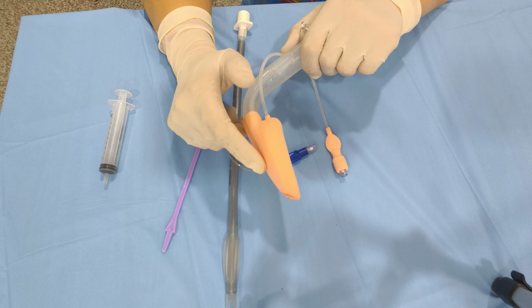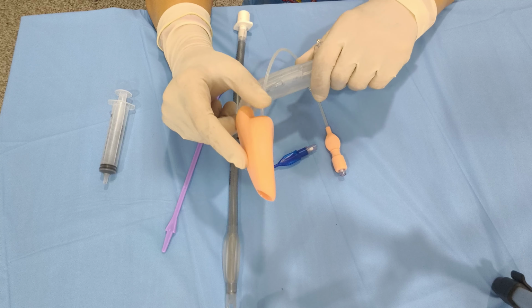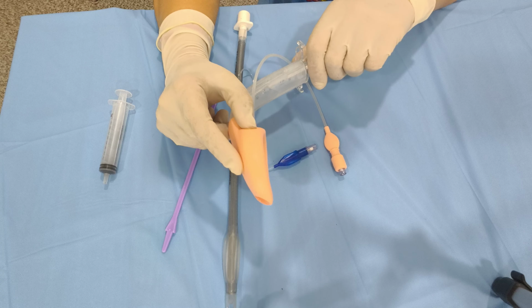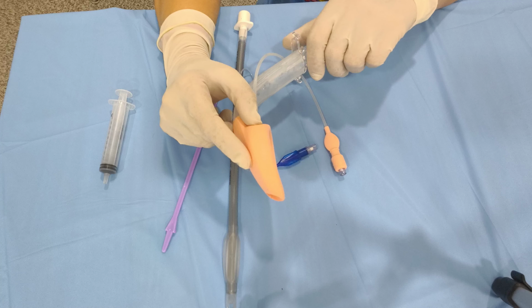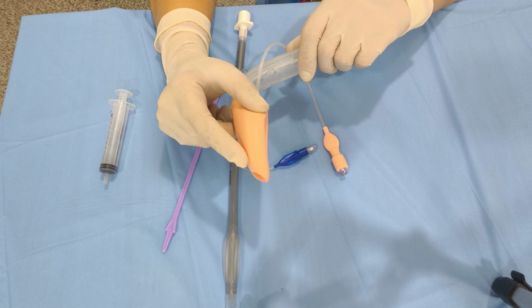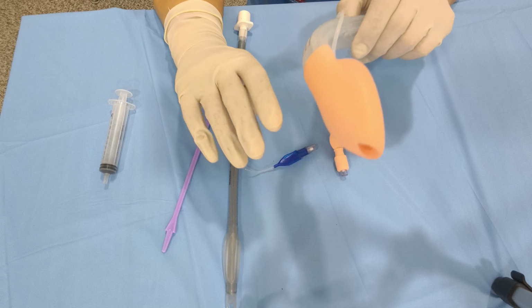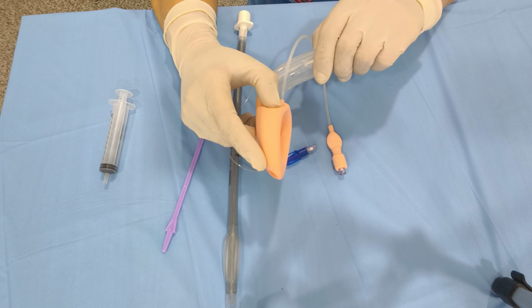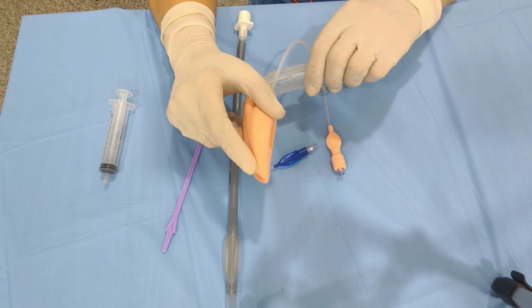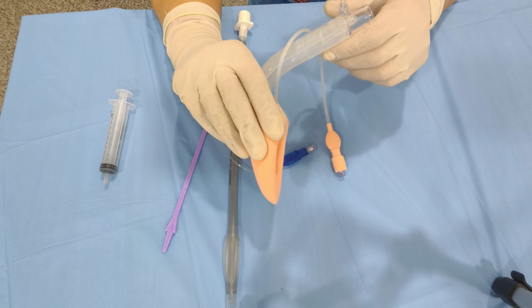Now what are the contraindications? The absolute contraindication is inability to open the mouth adequately, complete upper airway obstruction. There is a known supraglottic pharyngeal laryngeal pathology which prevents the introduction. Now what are the complications? Complications are sore throat, blood staining of the device, laryngospasm and leak if there is malpositioning.